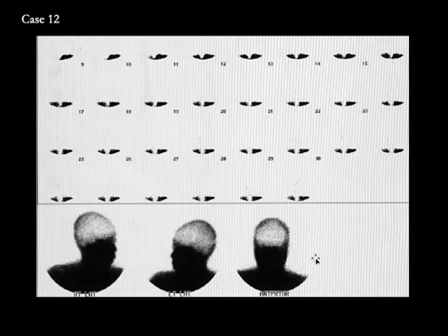These images have been captured by cranking up the intensity, and that is why we don't get to appreciate the hot nose sign, which is an indicator of perfusion in the external carotid circulation and not in the internal carotid circulation, and is a supportive finding of brain death. So this patient is brain dead.